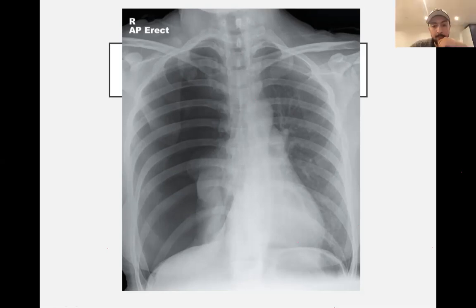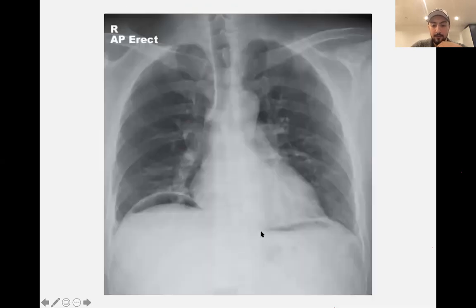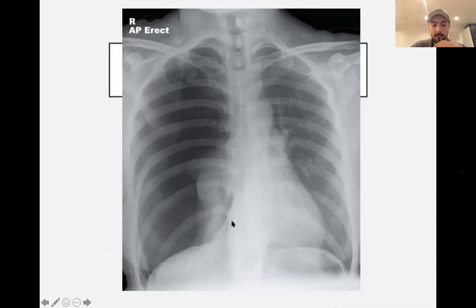Yeah. But that is well done actually. And also something to magnify the deviation. You can see here, actually, let me show you with the mouse. You don't see clearly the right atrium in here. It's a bit hidden. So that's another sign of mediastinal deviation. As you can see here, you're supposed to see the right side of the heart. For example, if you go to this X-ray, the right apex is clear here. But if you go to this one, the right apex is not really visible in here. That's because, like Abdurrahman said, it is deviated to the left side. There's a complete mediastinal shift.